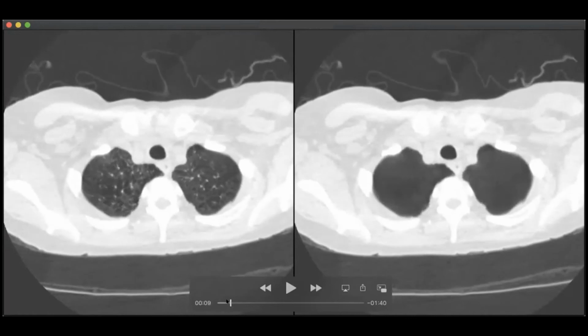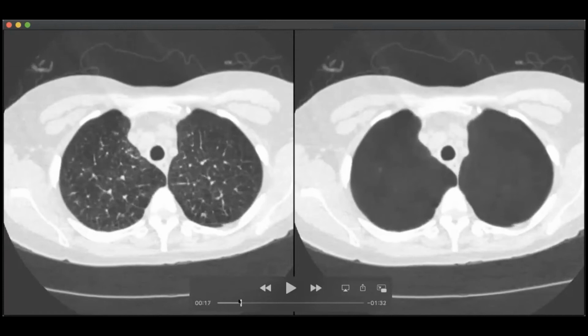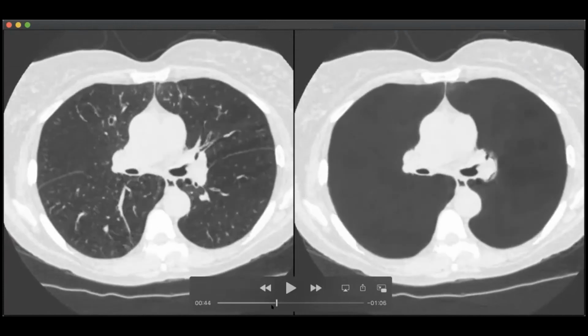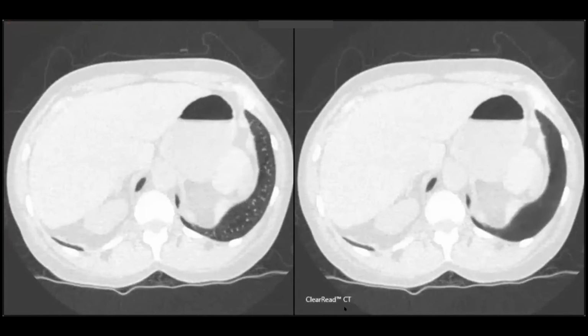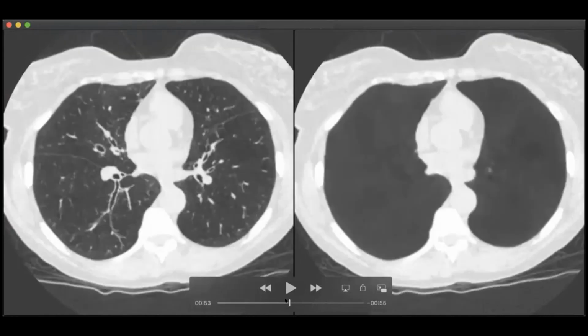So this is a patient with terrible emphysema, which we see here on the left source images. And as we're scrolling along, again, if you're specifically told to look for a nodule, then great, maybe you're going to see something, but that's not always the case. In fact, a large percentage of nodules, the majority, are incidentally detected.